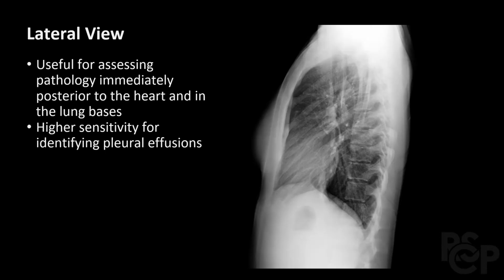Lateral views are useful for assessing pathology immediately posterior to the heart and in the lung bases. They have higher sensitivities for identifying pleural effusions as costophrenic angles where fluid may collect are deepest posteriorly.